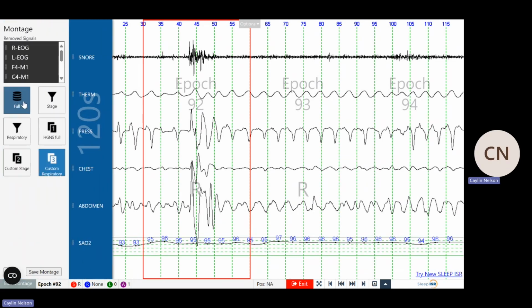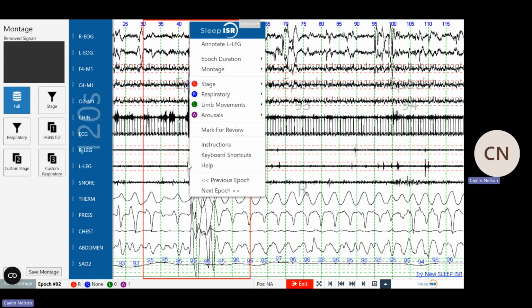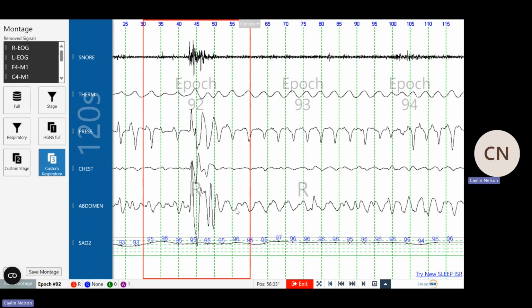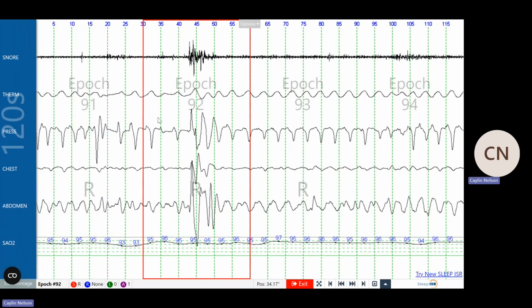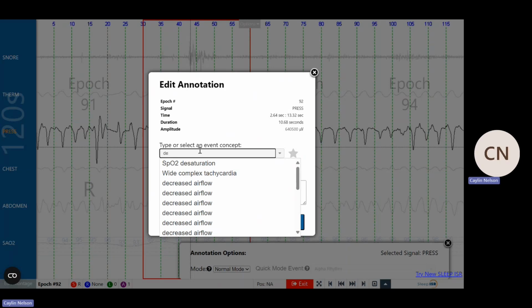So we're going to check in 92 to see if there was an arousal or something that happened here, and it looks like, let's see, yes, so there was one arousal. The only reason that arousal was scored, we can see in the chin channel you have an increase in chin amplitude, and that is how and when we can score our arousals in REM. If you remember correctly, in REM sleep, you will have those moments of a shift in frequencies. It's called paradoxical alpha.